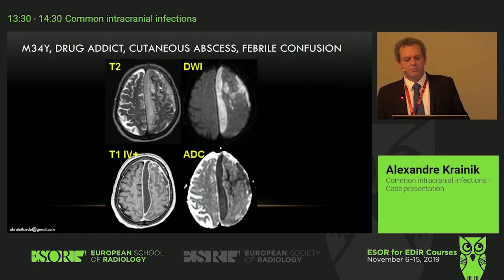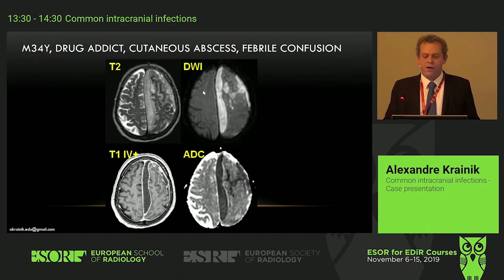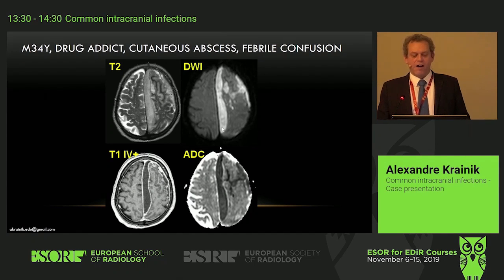You see enhancement of the meninges, pachymeningeal enhancement. Okay, pachymeningeal enhancement. Here. In the middle, there should be a hematoma. I don't know. Is it a hematoma? That is a question. No. If you had a CT, you wouldn't raise so many questions.